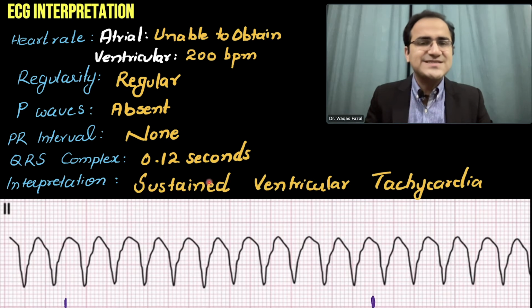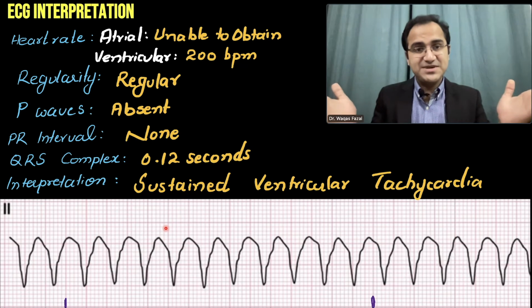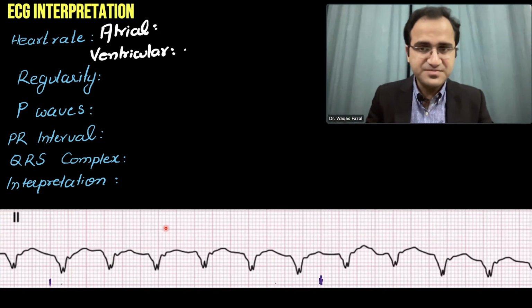Interpretation: this is a sustained ventricular tachycardia. Sustained because we do not see any sinus rhythm in it. It is a sustained VT.